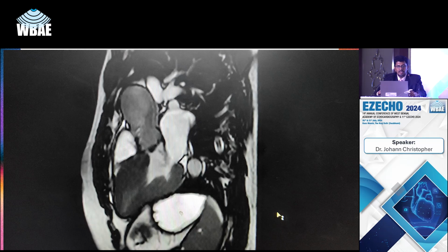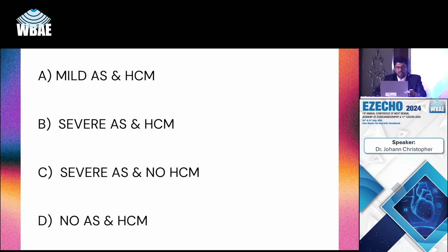Question number 14 is a 68-year-old male with a recent CVA. This is a cine MR image. It would be similar to what you would have seen on echo. So focus on the leftmost image. I think you saw that. And on the rightmost image, I have put a red arrow which is pointing to the pathology. Again, this is a very frequent test recommended in patients with stroke. So the pathology is the red arrow. I'm sorry, I can't play it again because it's shifting the slide.